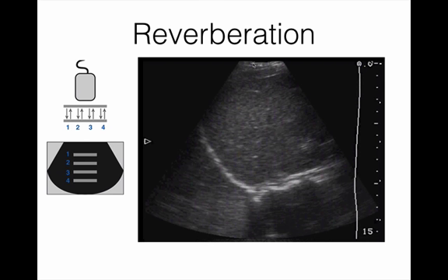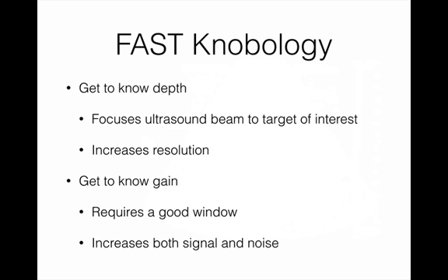So what happens with your ultrasound wave is that it goes to your diaphragm, comes back, gets translated as this image of your spleen or your liver, and then some of those sound waves will bounce right back to the diaphragm and bounce right back again. And then what you get is this mirror image of the liver or spleen on the other side of the diaphragm. It's not real, and you really have to recognize that it's a mirror image, and the mirror image is completely normal.